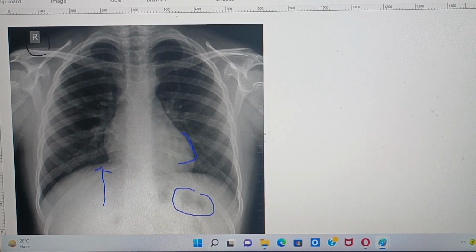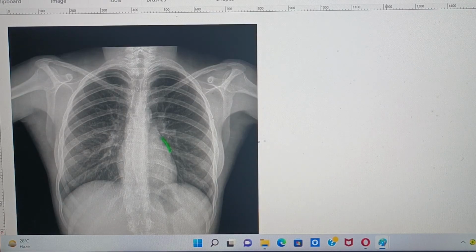After seeing the side of the patient, you must look for other features like the rotation. Is the centering normal, is it proper or not? To see the rotation, the important point is to see the trachea and then the spines. You can see this is the spinous process.